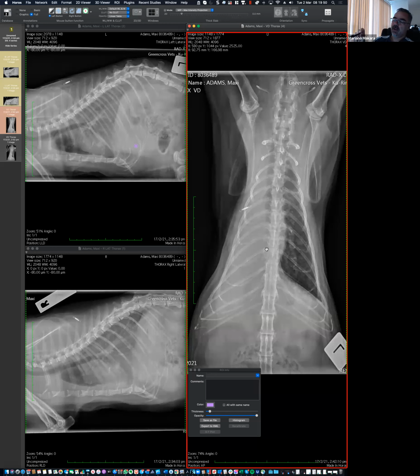So then the other consideration could be, what if it's not that we have two components, not that we have pleural effusion plus lung. Let's for a minute play the game that whatever soft tissue structure is in that right hemithorax is all lung.